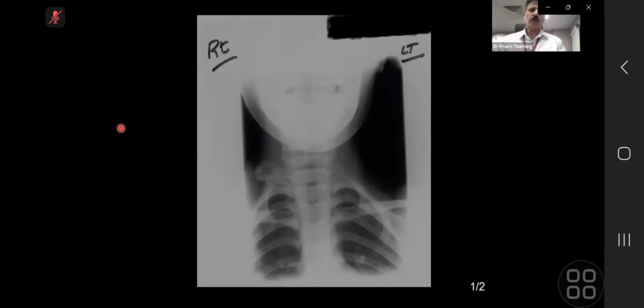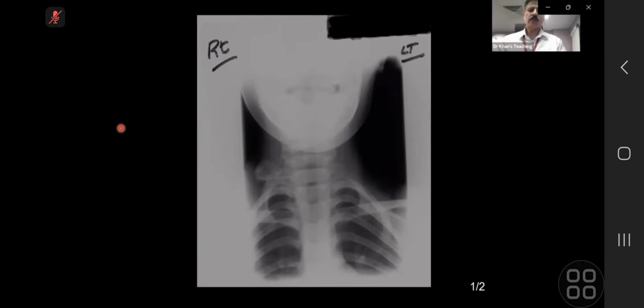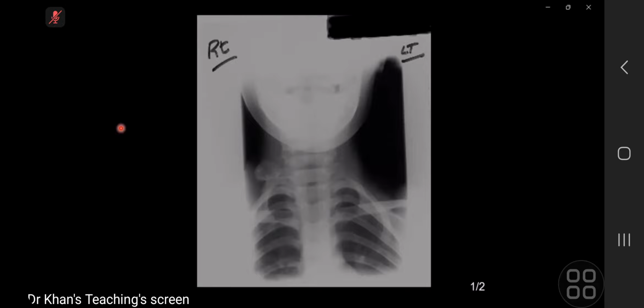So what is an omovertebral body or omovertebral bone? So it's usually a connection between the vertebra and the scapula. And when do you see that? I think there are some associated conditions you can get it with. Klippel-Feil syndrome is one of them. Pycnodysostosis. Do you see any stigmata of anything on this film? No.